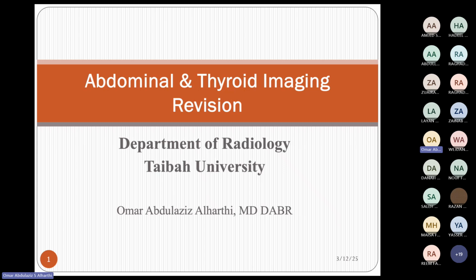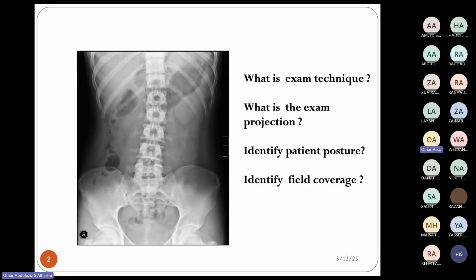It's going to be a revision. So first of all, we're going to start with this exam. What is this study? What is the projection? What is the posture and the coverage? Any volunteers?